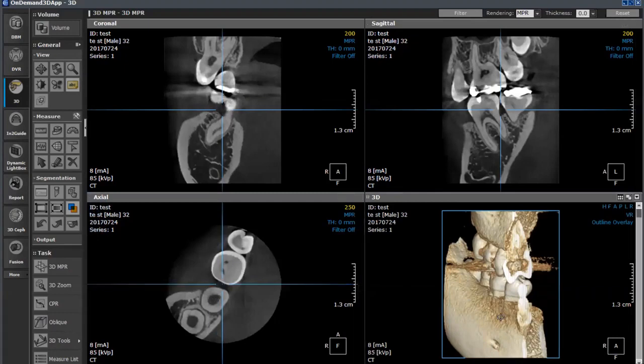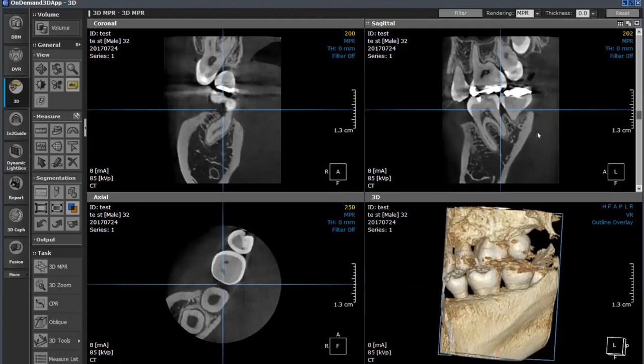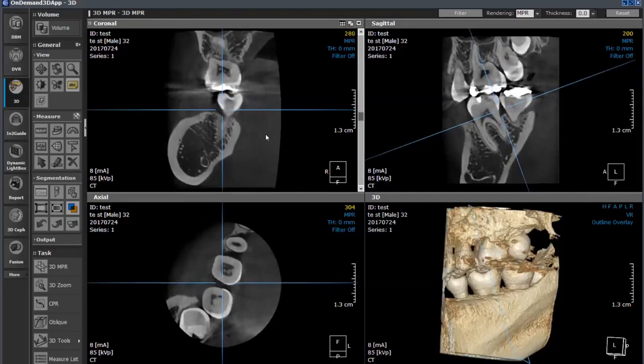this free field of view, where I can now focus on just that section of teeth and then evaluate. So again, I can still do buccolingual and mesial distal and then evaluate that tooth as it comes across.